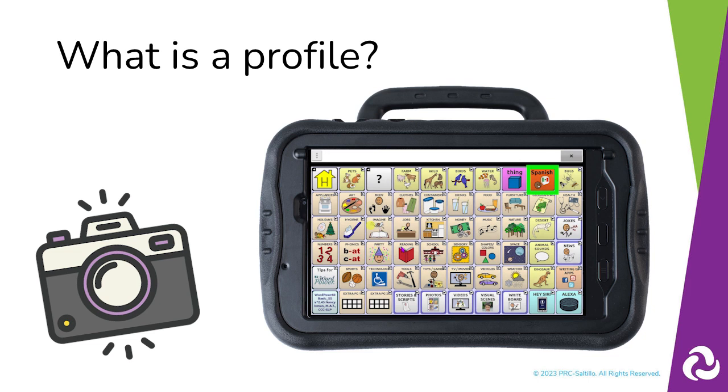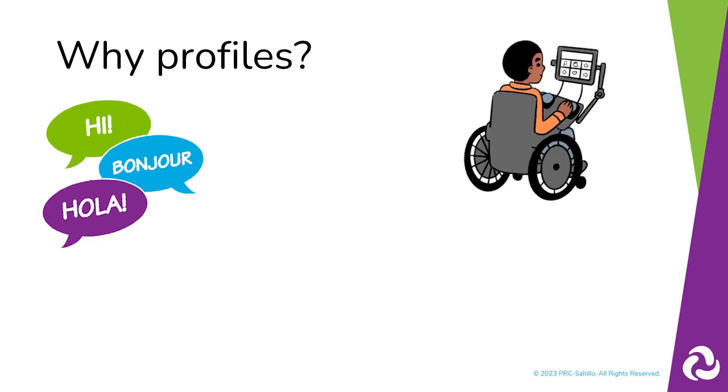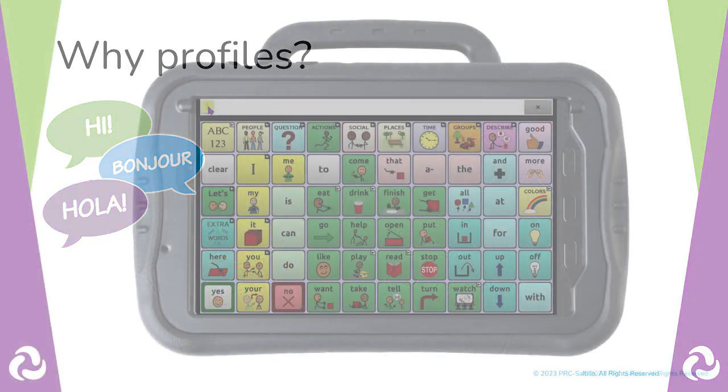Multiple profiles can be saved on a single device. A button can also be created to load a specific profile from within the vocabulary, minimizing the need to navigate through the menus. There are several reasons why you might wish to create a profile. A few examples might be to toggle between two languages, such as English and Spanish, to adjust access settings throughout the day due to client fatigue, to transition between two different vocabulary files, or to save settings for evaluative purposes.